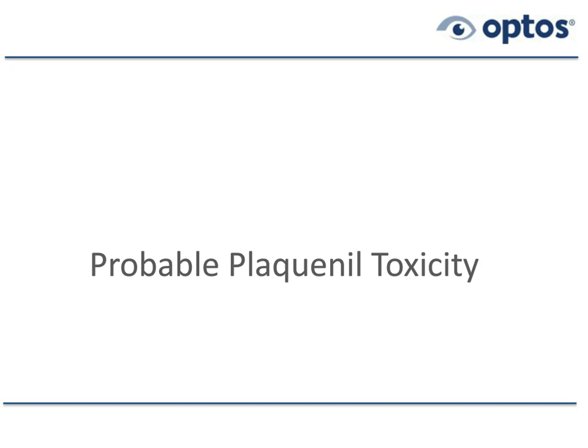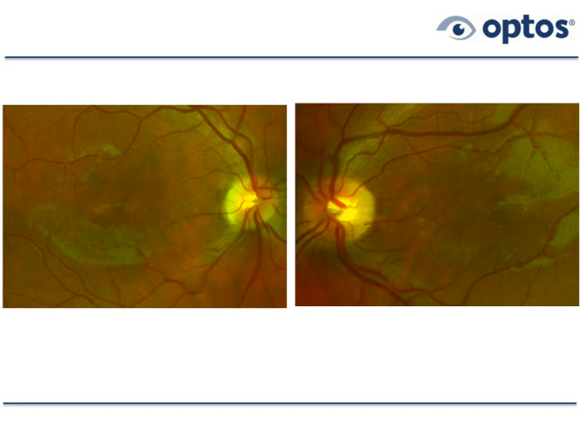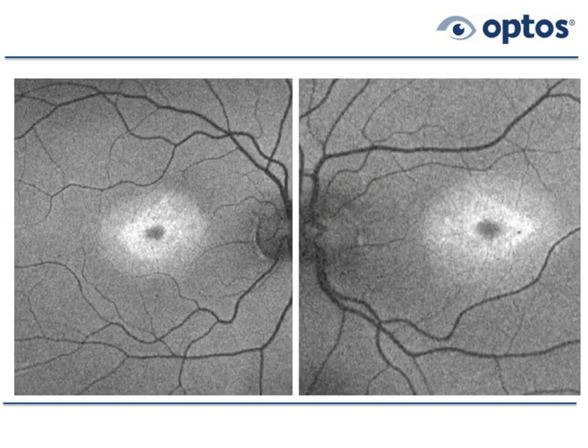This specific patient is 39 years of age with a history of having systemic lupus erythematosus for about 15 years. The maculas really look pretty good when you try to get good views of them close up. Acuities are still 20/20. Patient's not having any major problem, saying reading's a little bit slower than it used to be. And here's the autofluorescent image. And this is very typical of a bullseye lesion.